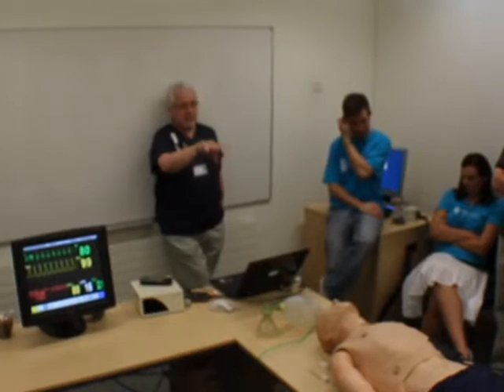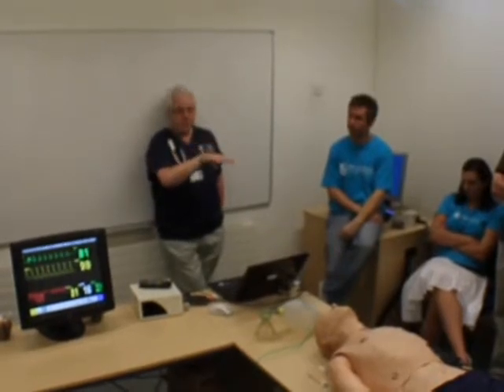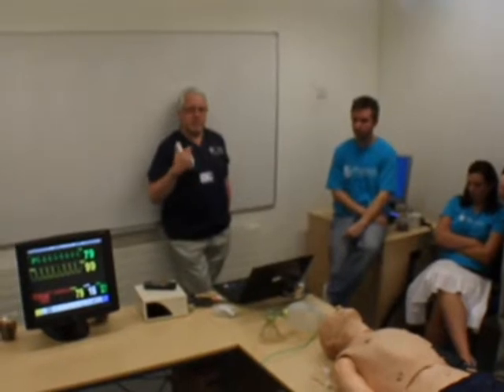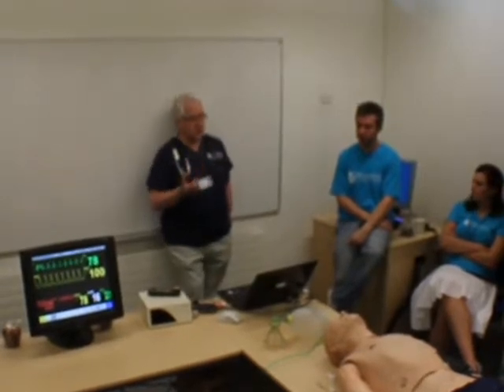But we don't only use SimMan for that high level of simulation, which is what we do in Year 5. We also use him as early as Year 1, because we'll use him to help teach the students some science around the function of the human body, the physiology of how the body is controlled.